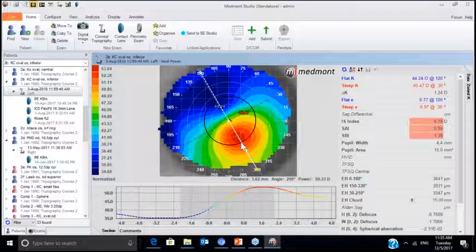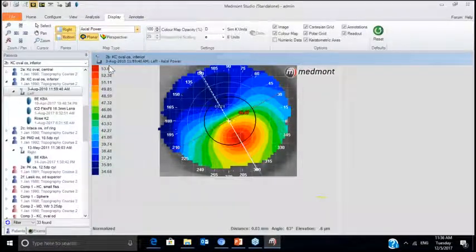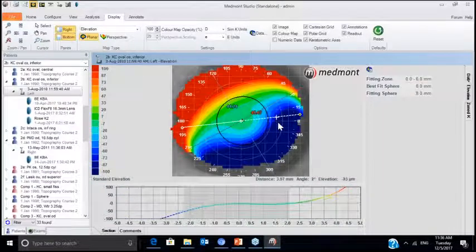And if we take all the powers of the cornea within the inferior cornea and average them out, compare that with all the powers of the superior cornea, we see that this eye has an inferior cornea that's 6.78 diopters steeper down here than it is up here. In other words, the inferior cornea is much, much steeper than the superior cornea. And since keratoconus presents in the inferior cornea the greatest percentage of the time, around 90% of the time, we can use that as a guide for when we're dealing with an irregular cornea.